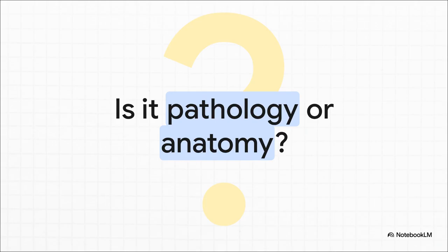And here's exactly why that knowledge is so critical. It's a classic trap. The mental foramen can sometimes line up perfectly over a premolar root, and it can look exactly like an abscess at the tip of the root. So, how do you tell the difference? Well, the key is to trace the lamina dura. That's that thin white line that goes all the way around the root. If that line is intact and unbroken, you're almost certainly looking at normal anatomy, not a problem.